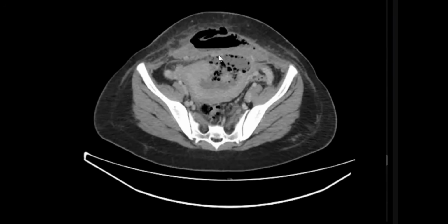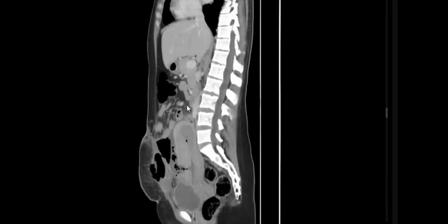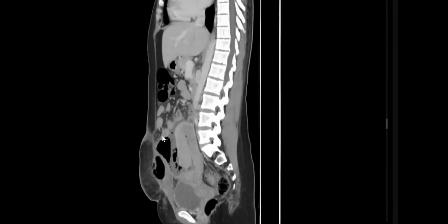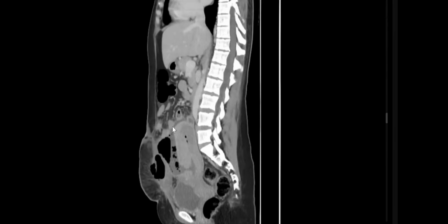The collection tracks anteriorly into the anterior abdominal wall, involving the rectus muscles. In my routine practice, I would like to immediately, urgently involve the... No, no. Before managing the case, comment on other planes. Okay. So in my routine practice, I'll check other planes to confirm this possibility. Yes, we have a continuity through the defect at the scar and the periuterine collection. It's surrounding the uterus. It's not continuous with the peritoneal cavity, but actually it's around the uterus.